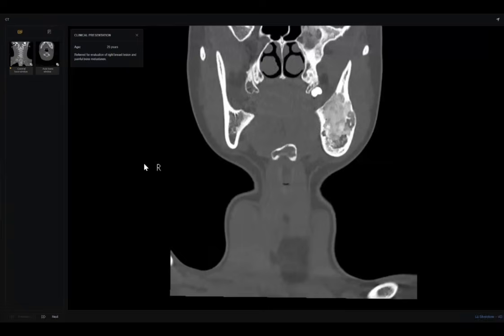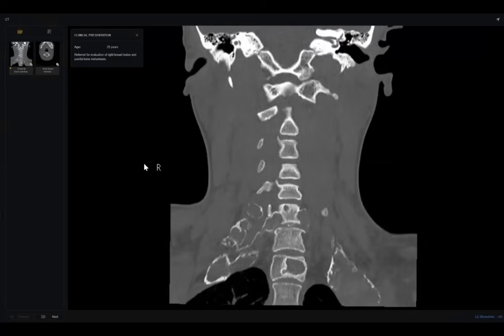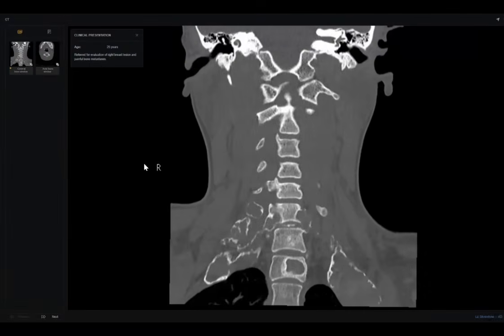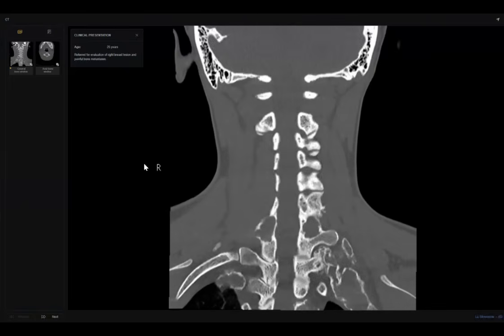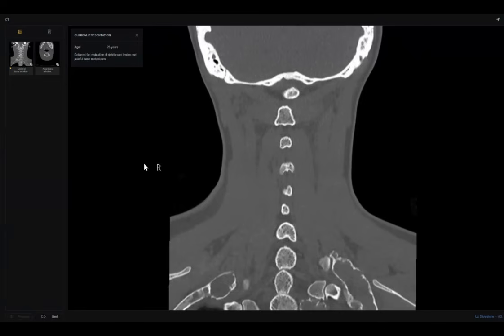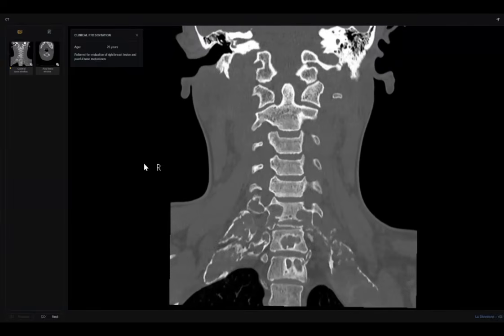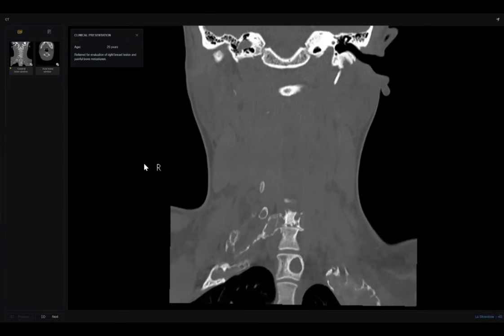Look here. What happened there? This ground glass appearance of the mandible and the base of the skull. So what's your final diagnosis? So this is a case of fibrous dysplasia. Which type? The polyostotic fibrous dysplasia. What is your next further investigation or further steps?